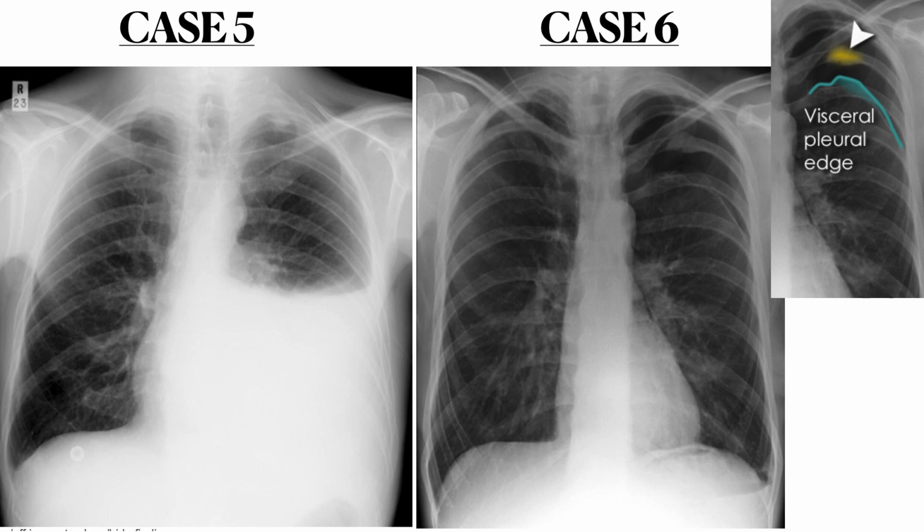So we go back to the image and take a look at the chest X-ray. We see that there is no displacement of the trachea or mediastinum, which means that there is no tension. So it is only a pneumothorax without tension.